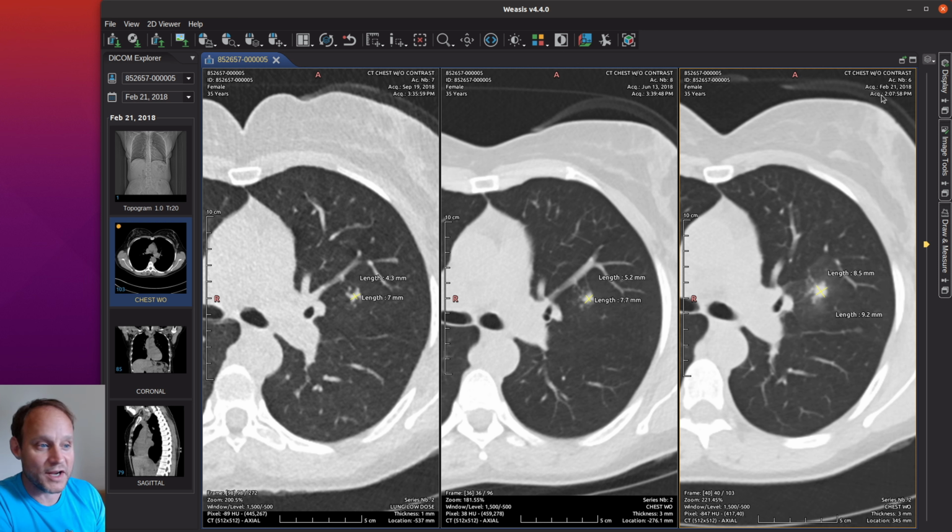The dates are anonymized too, but the time length between the dates is preserved. And here you can see that there's this decrease in size from here to here. It's about the same size from here to here, but it looks a little bit better, in particular between the most remote prior and the current study. And there are some other findings too on this examination.